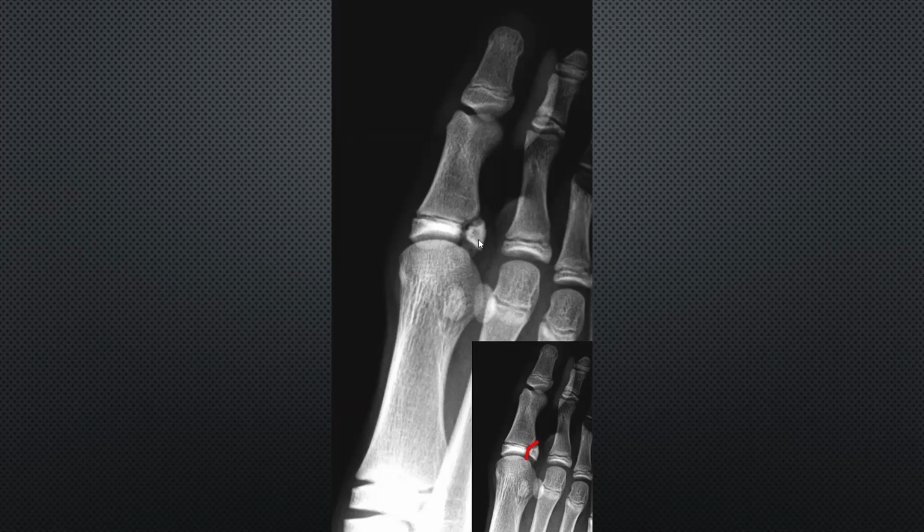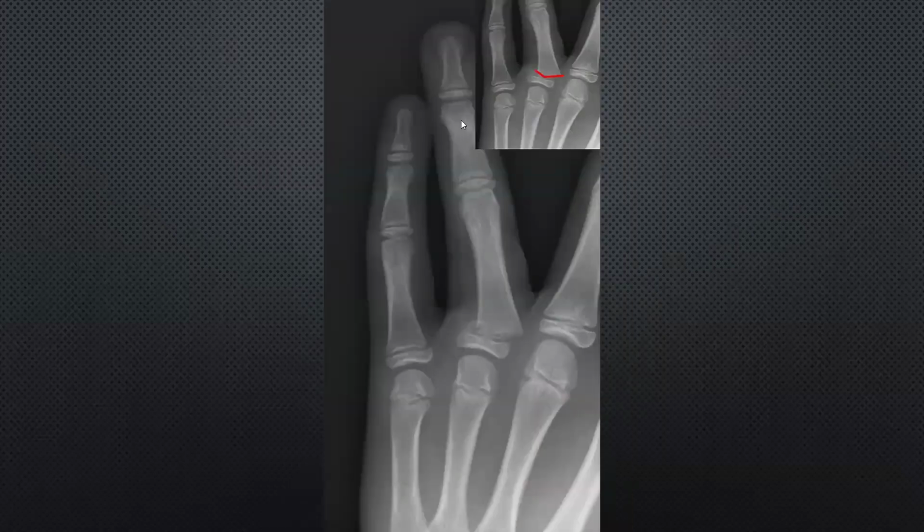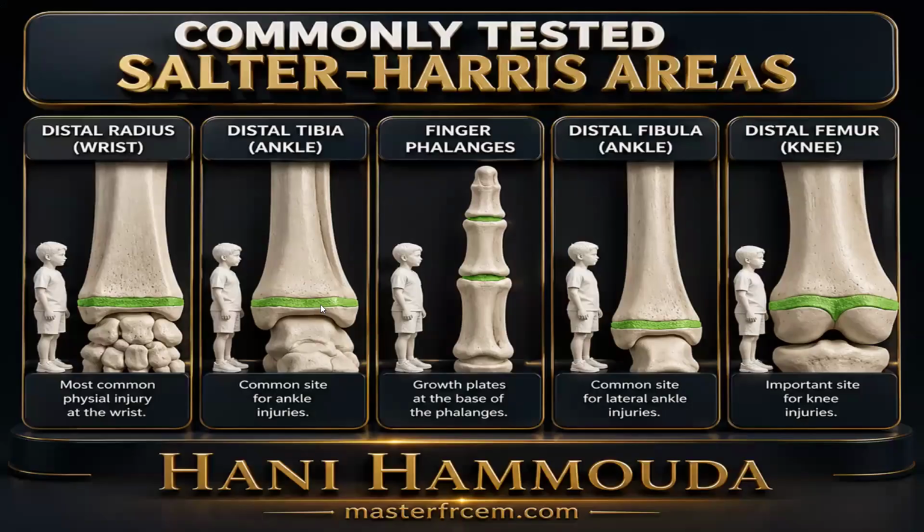So a Salter fracture here. So here you can say the alignment is normal in the big toe. Here alignment is normal. If you draw the midline from up to down, it is normal. But here there is malalignment, easy. If you draw the midline here, it will be away from this part. So malalignment here. I hope it's clear.